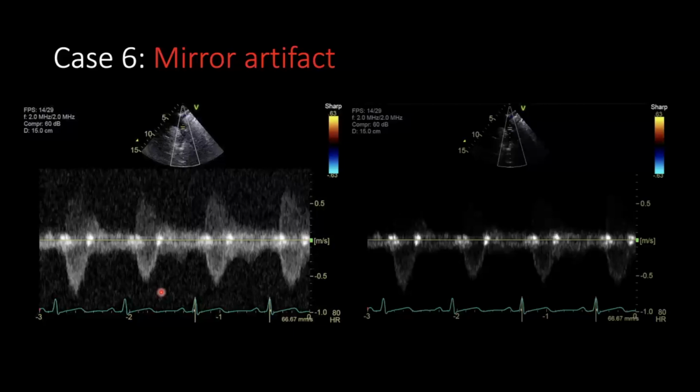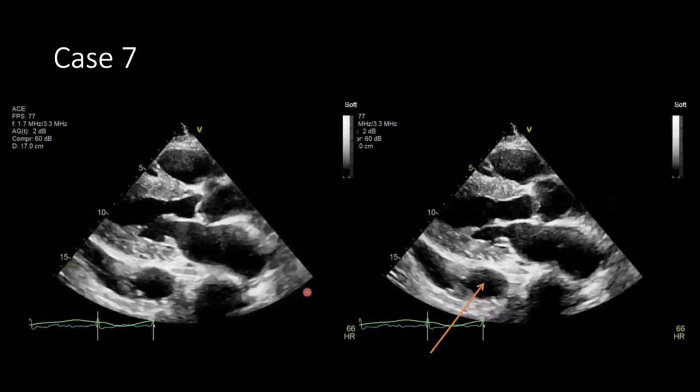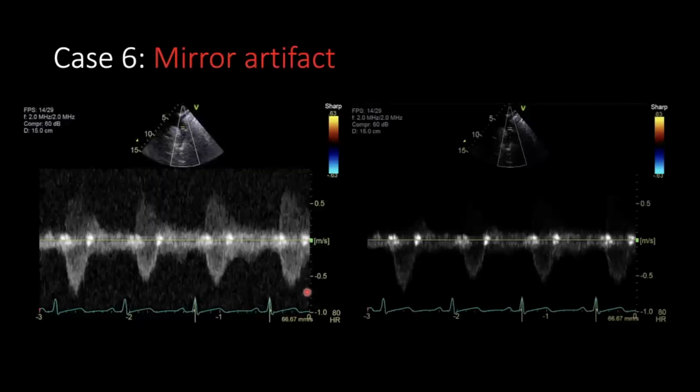So this is the same patient that illustrates this really nicely. Also not infrequently seen. So how does that actually occur? And what's the mirror? Where's the mirror? So my understanding of it, and I'm sure Dr.